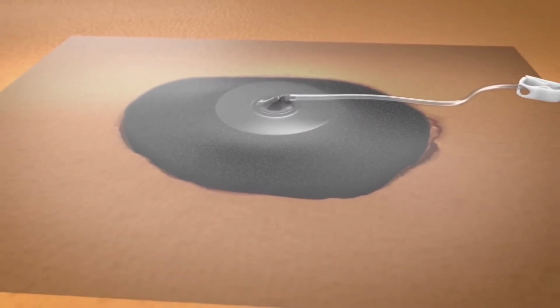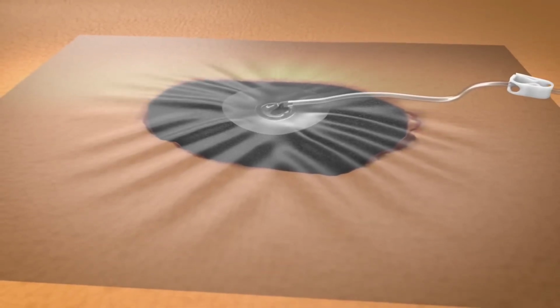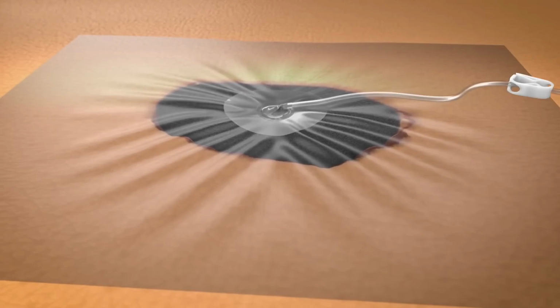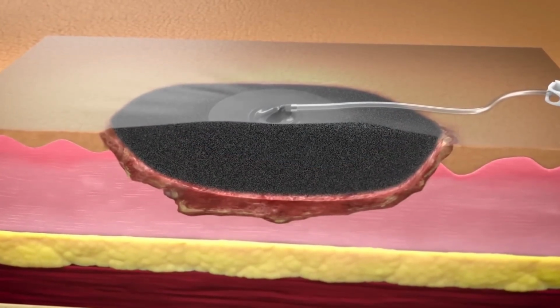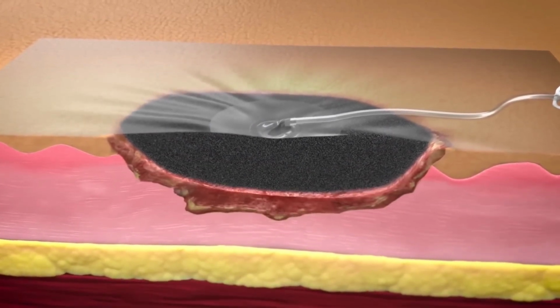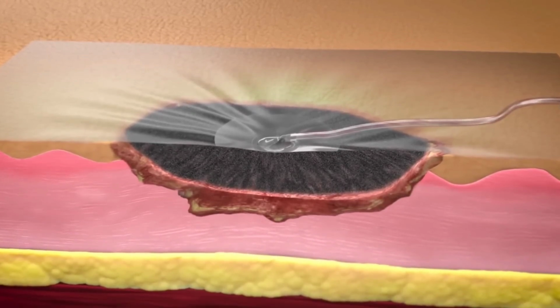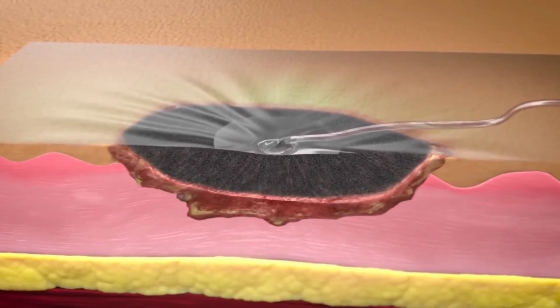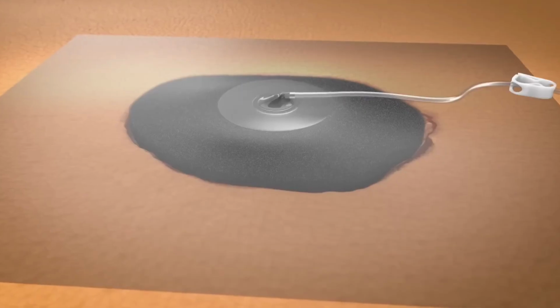to the therapy unit. 3M sensor track technology helps provide uniform negative pressure to the wound surface. It also provides alarms when there are conditions that would impact negative pressure wound therapy. The application of uniform negative pressure when delivered by 3M VAC therapy applies mechanical forces, macrostrain and microstrain, that together remove exudate and infectious material, reduce edema, and promote perfusion, creating an environment conducive to the formation of granulation tissue.